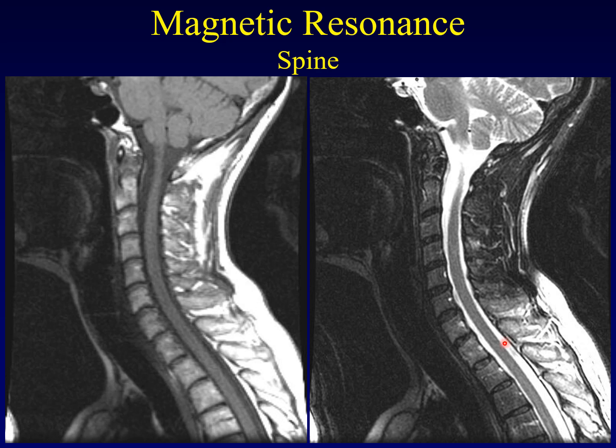This overcomes that problem we were talking about on CT of the spine. It might look as though the spinal cord is tapering off here. It's getting narrower and narrower and essentially disappearing and doesn't even hook up to the brainstem. Well, that's not true. The problem here is that anatomy doesn't sit in one perfect plane. You might imagine in an ideal world that the spinal cord sits right smack in the midline sagittal and never wavers from that position, but that's just not true.